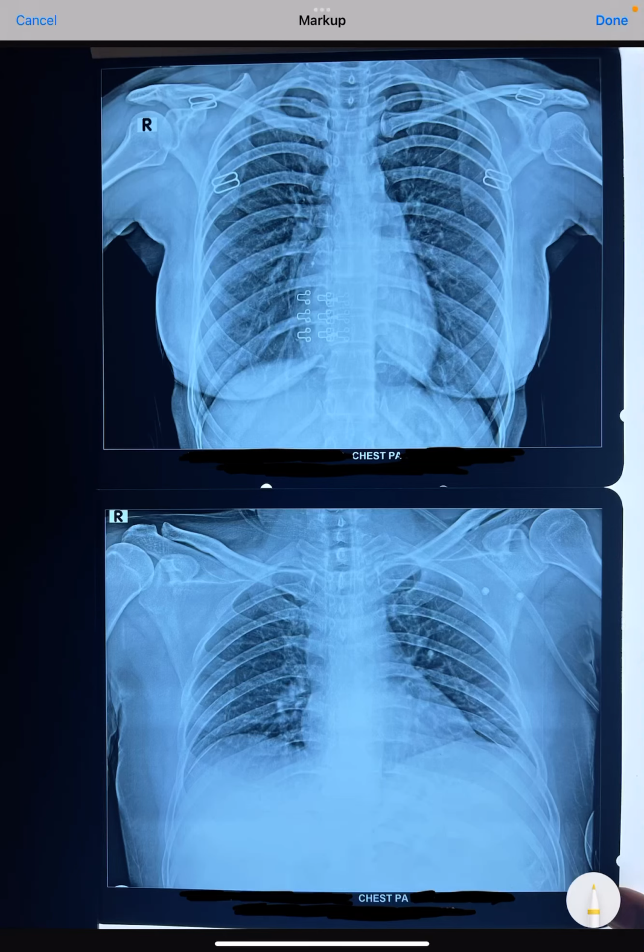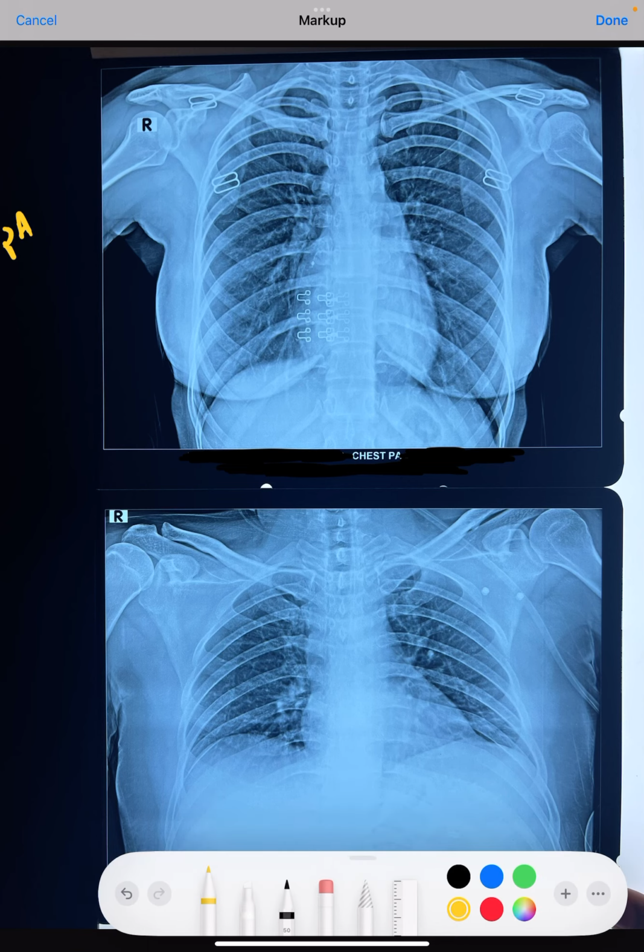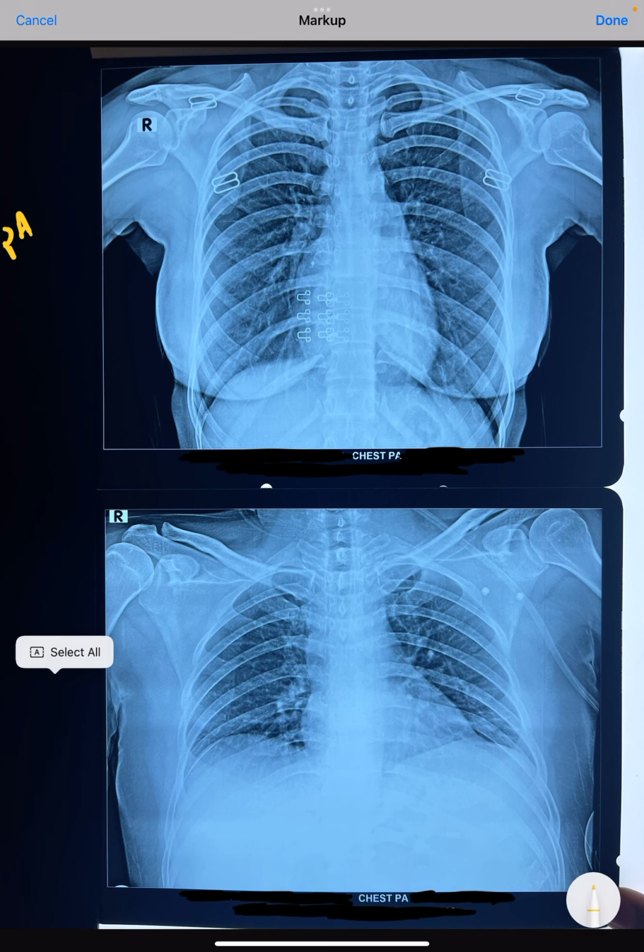Now we'll be discussing chest X-ray posterior-anterior view in deep inspiration and in not so deep inspiration. It's very important for us to understand that if you really want to have a very good understanding of X-ray of lungs or mediastinum or heart, the X-ray must be done in posterior anterior view in deep inspiration. It means the patient should take deep inspiration and withhold the breath till the X-rays are shot.